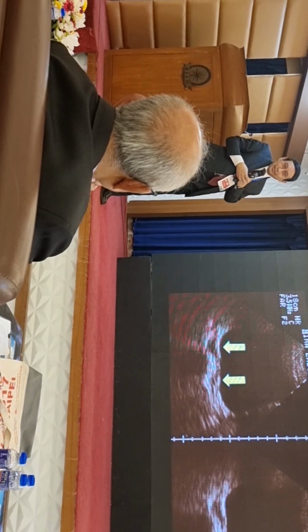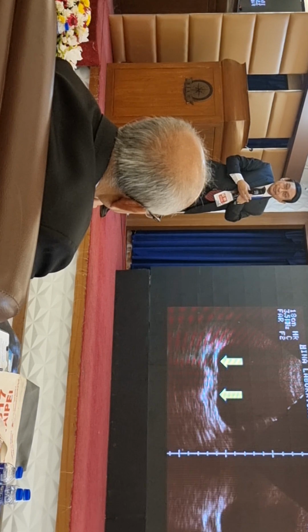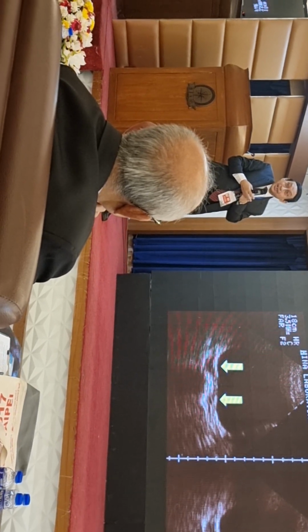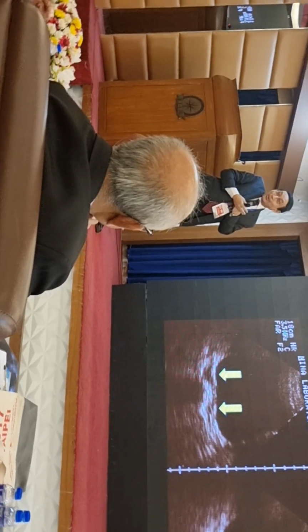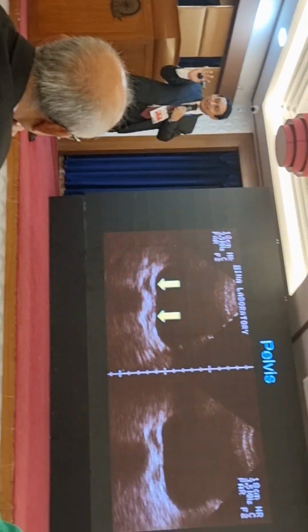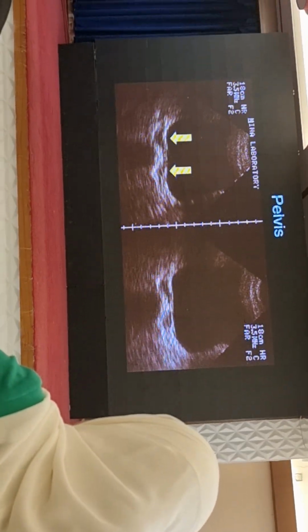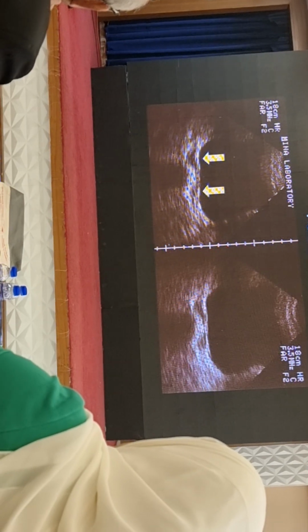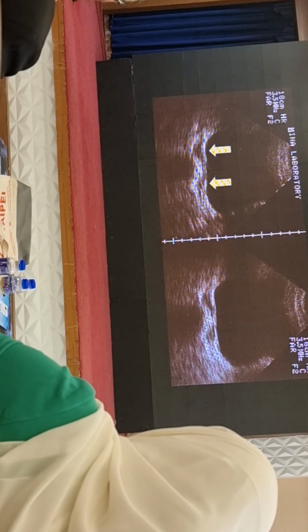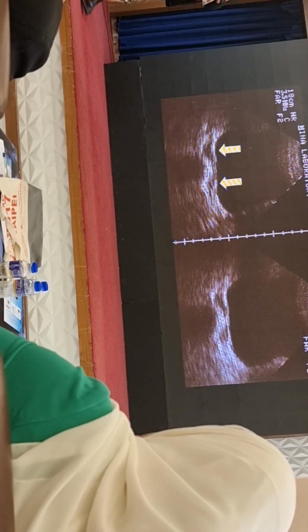Any idea? This patient has had a hysterectomy. After hysterectomy, we may get this type of appearance. So, history is very important. I used to say to my students that history is part of the ultrasound examination. Without history, ultrasound examination is not possible. So every time we must take history.